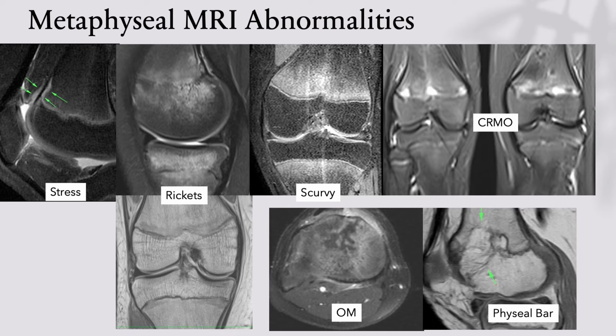Last but not least, when you have all these periphyseal abnormalities, you can have abnormal fusion across the physis, and here it's important to look at the physeal bar and to talk about what the size and extent of that physeal bar is, because the physeal bar has potential to distort growth, and then people can do procedures that help in improving or changing the way the bone grows by applying clamps, narrowing down or preventing growth of the physes and maintaining the congruency of the bone.